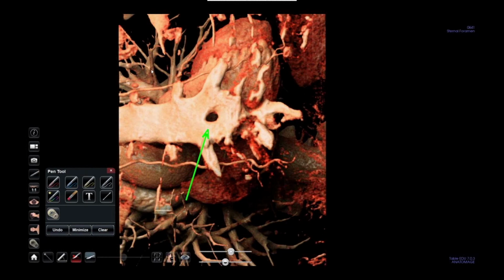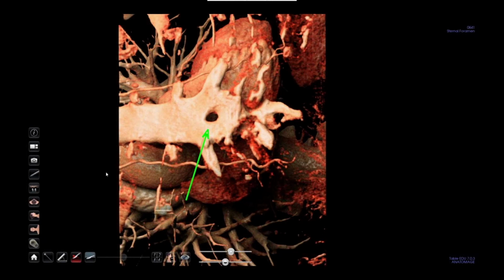We are talking about this sternal foramen, and we can think to do again a comparison between this type of data with a patient and another one from a cadaver. Remaining on Victor, so on the structures of Victor, I can see if he had the sternal foramen.